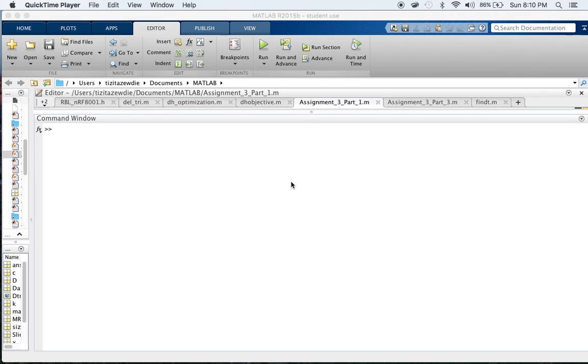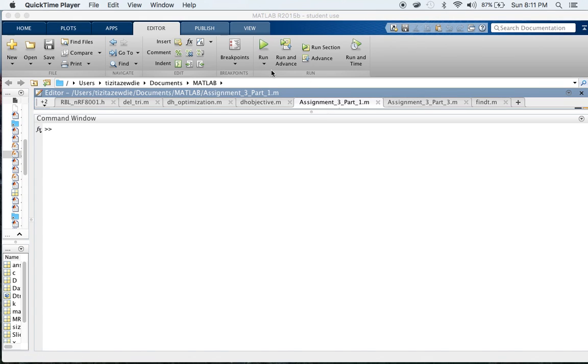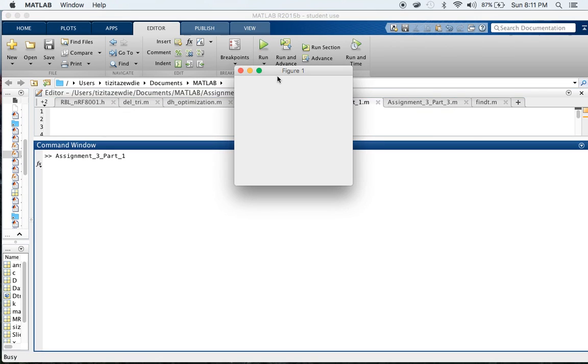Hello, in this video I'm going to be covering my assignment 3 for medical robotics and systems class, and there are going to be 3 parts to this assignment. I'm going to start with the first one, where I've created a function in MATLAB that allows me to outline a region in the slices of an MRI scan, and after I outline those regions I'm able to create a 3D model of that structure. So I'm going to go ahead and show you.